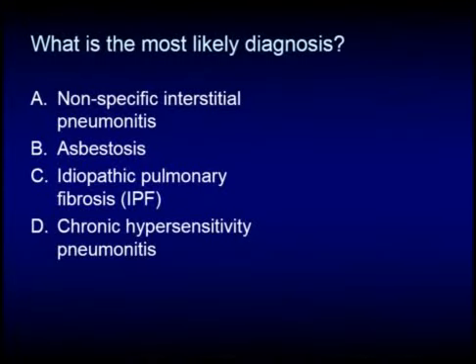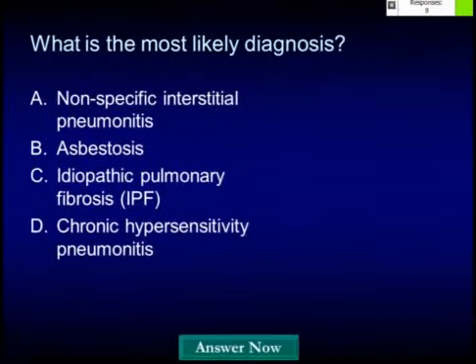So what do you guys think? What is the most likely diagnosis here? Is this NSIP, asbestosis, IPF, or chronic HP? Please vote.